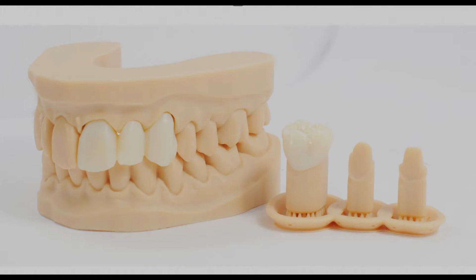That is how our model will probably look like. So you're getting a solid model to fit check crowns and bridges and adjust adjacent contacts and occlusal contacts, and you get extra dies to adjust things like the margin or more detailed adjustments if needed. So let's jump into DentalDB.